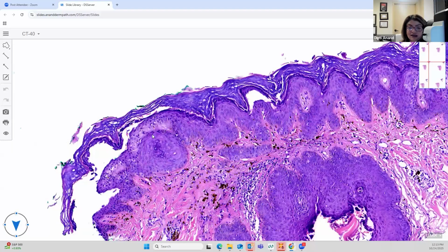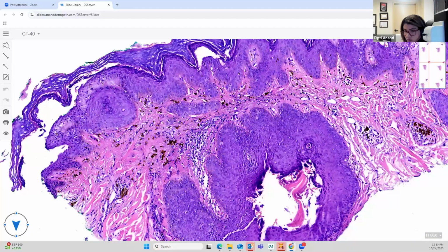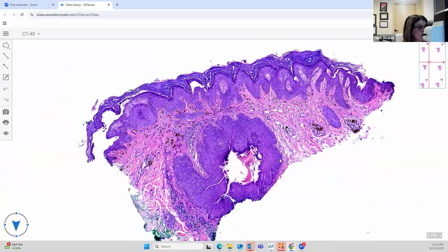It could be very staphylococcal scalded skin syndrome like, wherein you get very minimal inflammation in the subcorneal split, superficial acantholysis, or it could have neutrophils like what you would see in bullous impetigo. So a pemphigus foliaceus blister could be cell poor or cell rich. This is the one that would mimic staphylococcal scalded skin syndrome. So this is pemphigus foliaceus with involvement of the hair follicles. And so the answer here would be the A, which is the predominant autoantibodies against desmoglein 1. Did everybody get that? Okay, good.